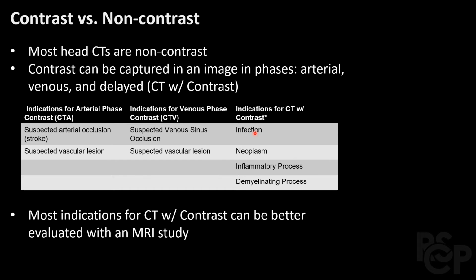Now, if you pause at this point and take a snapshot, a CT head scan at this point, as the contrast is traveling through the patient's arteries, that is what we consider to be arterial phase contrast. This typically occurs, depending on the patient's cardiac output, about 15 to 20 seconds after the administration of contrast.